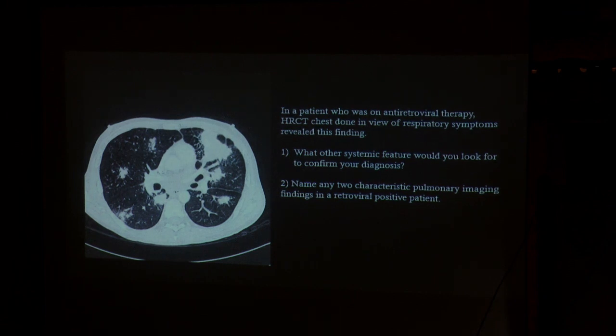So here we have a patient on antiretroviral therapy and HRCT chest was done. So what is the feature here and what is the diagnosis?